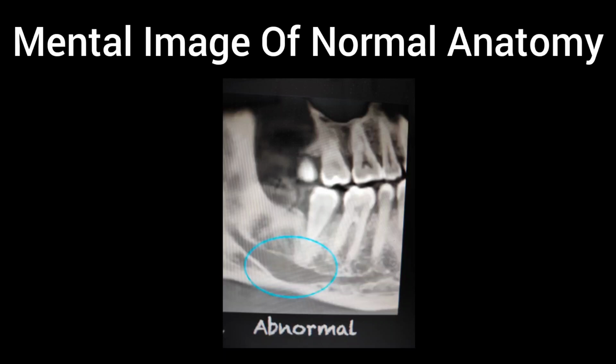Here we see the mandibular canal actually looks dilated, and it looks enlarged in this one particular area. So we see the normal contours of the canal, and then it widens before tapering down again and having a more normal diameter. So this would be considered abnormal. So there is pathology within that location of the canal.